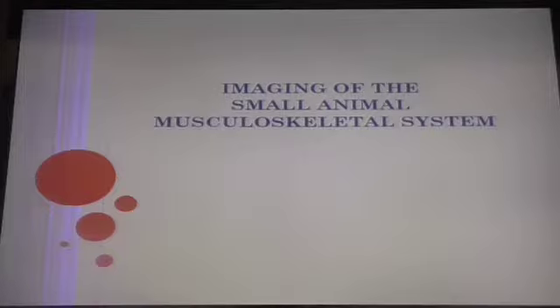Y'all should be able to recognize those views, and you should be able to recognize all those common conditions that I just presented to you. Know the radiographic findings and recognize. Okay, I'm going to move on to small animal.